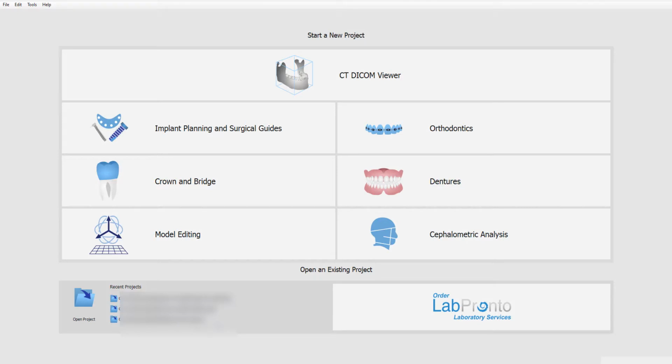Hey, this is Fayette Williams, and today we are planning a case for immediate implants and teeth on a fibula jaw reconstruction. This is a guy with squamous cell carcinoma on the lingual mandible, and he's getting a resection from molar to molar with a fibula in three pieces, and we're going to plan for immediate implants and immediate teeth. So after the virtual surgical planning, we're opening up.